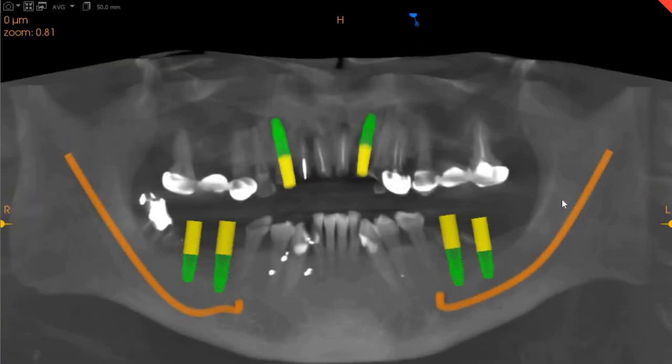As you can see, these implants have been placed. We will share a report. These are the ideal location based on the CBCT. These are CBCT guided and prosthetically guided placements, but we would advise an extra implant on the anterior maxilla for better bone support and a more long lasting prosthesis.